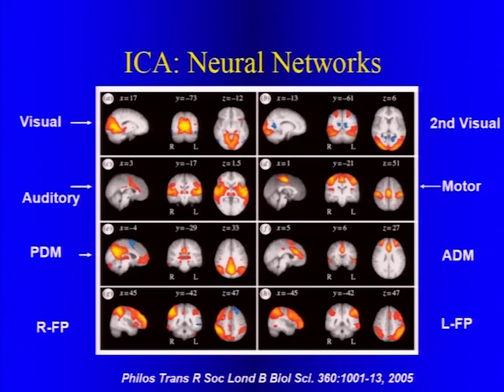So we've come to realize with this post-processing that these are the typical areas that we see when we search in this way, and these are displayed on these echoplanar BOLD images. We see areas that look like visual cortex and the auditory cortex regions.